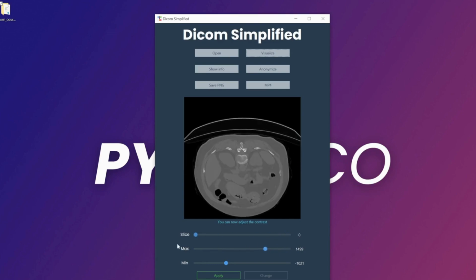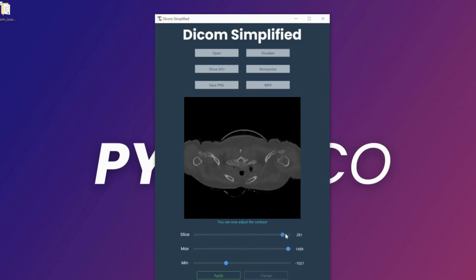So for example, when I am here, I am taking the image 0 from the directory, which is the first part of the list, the list that glob returned. If I go here, which is the first one, second, etc., until the last image.